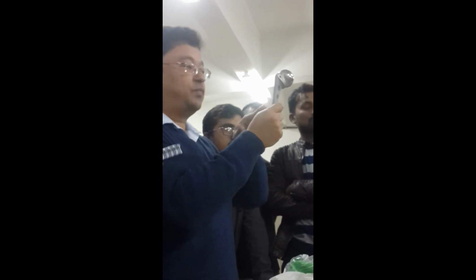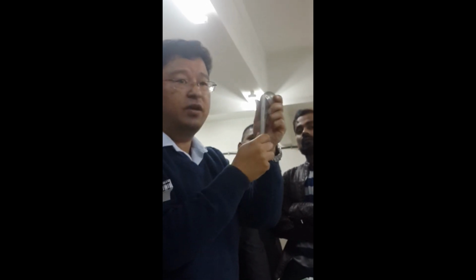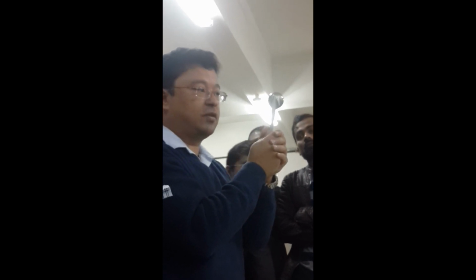It is for extraction, because while inserting it sometimes does not fit, so you have to keep on manipulating it. Okay. And what are these holes for? They are for bone growth. What you do is, when you put in the head, we take the bone from it and put it here. You put it and there is bone ingrowth and it becomes more stable, because in this we are not using cement. This is a cementless prosthesis. In Thompson you have to put cement.